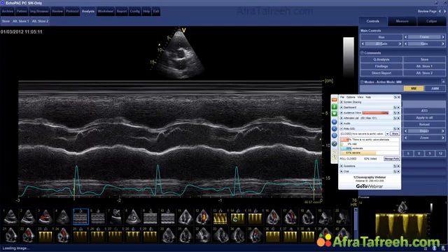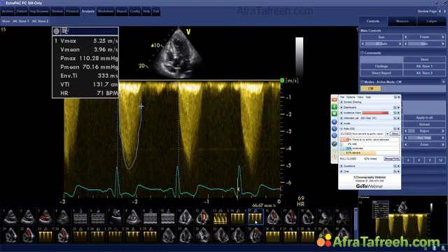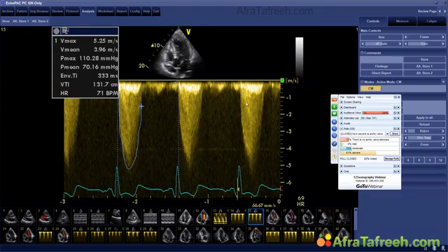And if you look at the spectrum, you could have seen that something is wrong already in the spectrum. Why? Because the nice thing is that you see two spectrums within one. You have the typical spectrum of a fixed stenosis. This is the membranous part of the stenosis. And then you have kind of a dagger shaped spectrum within the aortic valve spectrum. This is the dynamic obstruction you get because you have SAM.